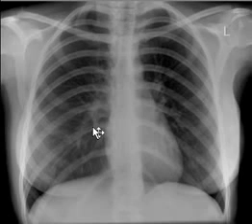This suggests that the patient does not have any emphysematous lung disease. Both diaphragms are making a dome shape, again to confirm the previous suggestion. Lung parenchyma is visible in the retrocardiac area to suggest that the left lower lobe is not collapsed. All other lobes are normal as well. The heart size is roughly less than half of the thoracic diameter, to suggest that there is no cardiomegaly. Radiologists have electronic tools to measure the cardiothoracic ratio, which we unfortunately do not have.